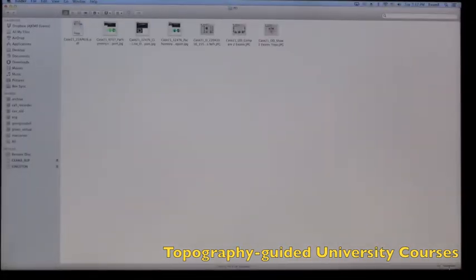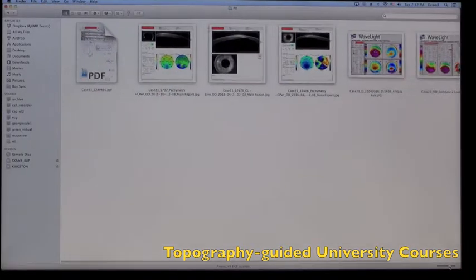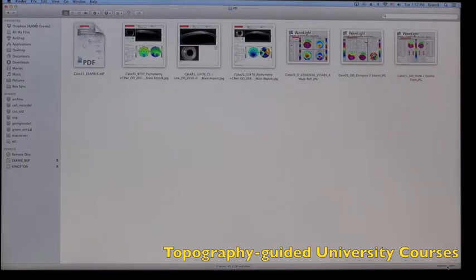So the post-op data, we can see here again, a late post-op exam, probably 6 months to a year. Next to that, OCT, cornea pachymetry and epithelial maps, a sagittal OCT image to show the depth of cross-linking achieved, and then pentacam comparisons and topometric comparisons. So this is your guide through this large number of cases.